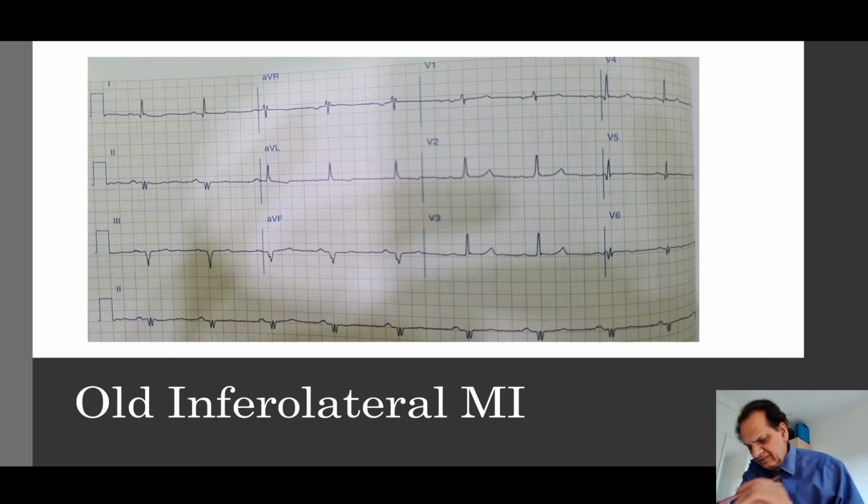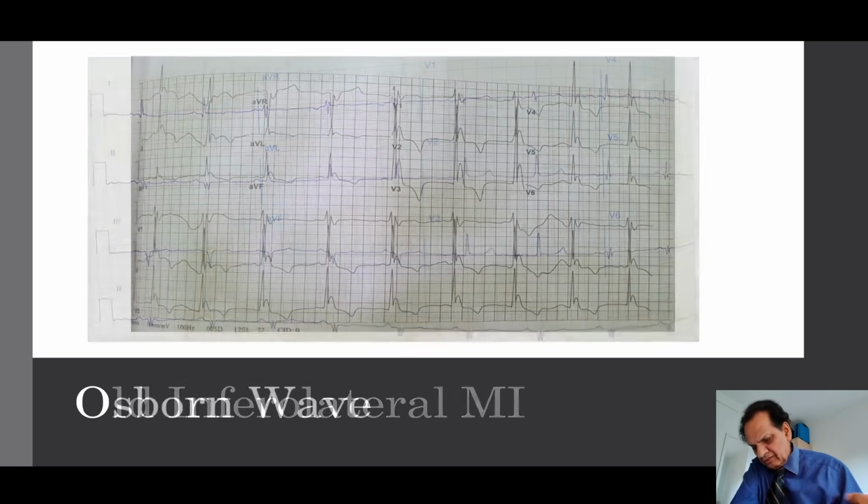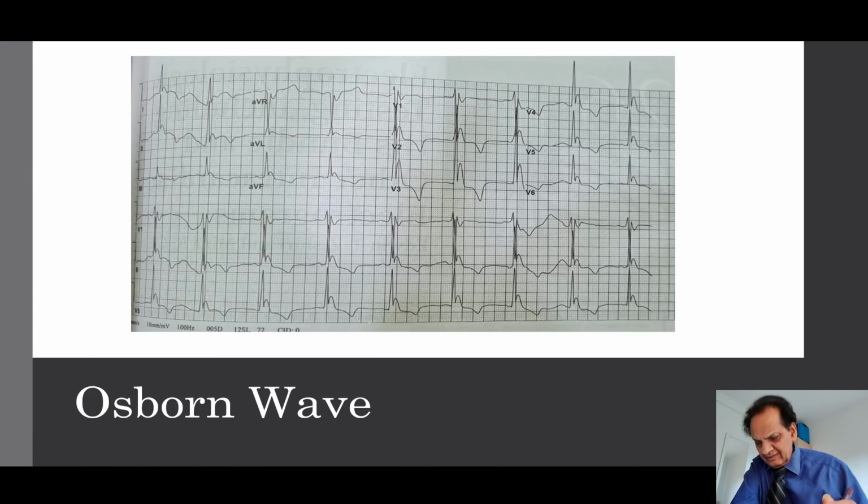Inferolateral MI, you can see Q waves here and Q waves in V5, V6. Good picture that way. Posterior wall was not involved in this case.